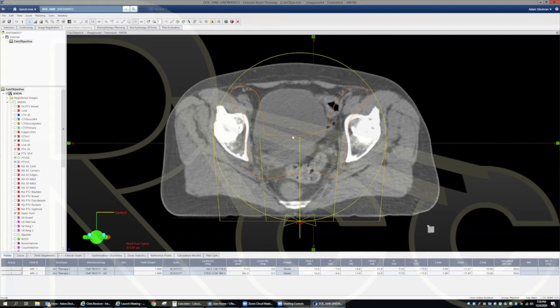And those structures, you more or less just by experience, for example, when you show the ones that just how low you go, how posterior you go on the border of that corner? That's a good question. So the edges, I do 5 millimeters every time. The corners, yeah, just a little bit of experience. You can just look at it and you can think, there's no right or wrong answer, to be honest with you. I could have drawn them cut off here and just even smaller, probably would have done the job.